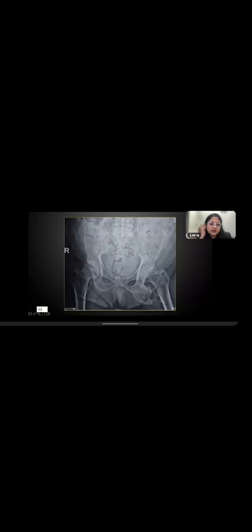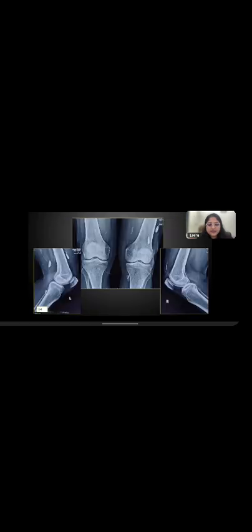If you get a spotter like that, you have to write the correct position of the bone. So, osteochondroma of the left inferior pubic ramus, that would be, I guess, the correct diagnosis. Okay. So, that is done. Now, case 14.